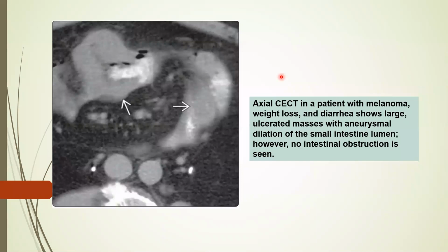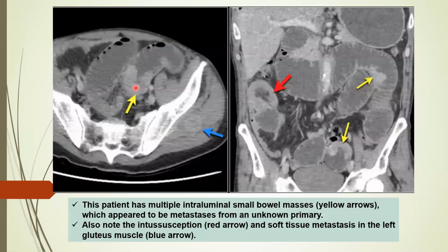This is another case of metastasis of melanoma. The patient presented with weight loss and diarrhea, and there are large multifocal masses in the small bowel.